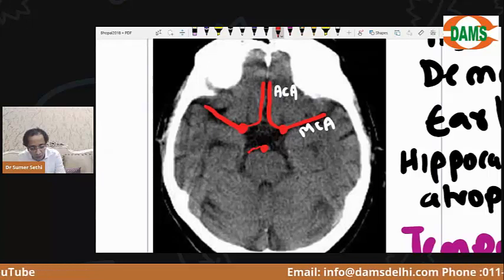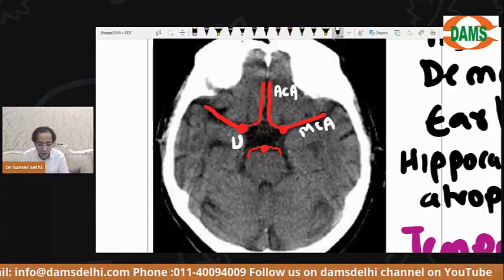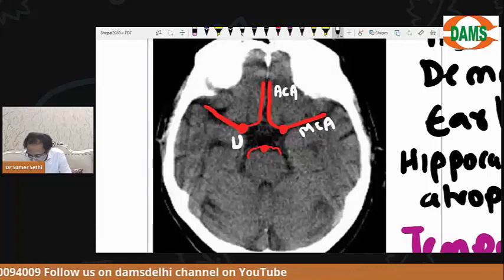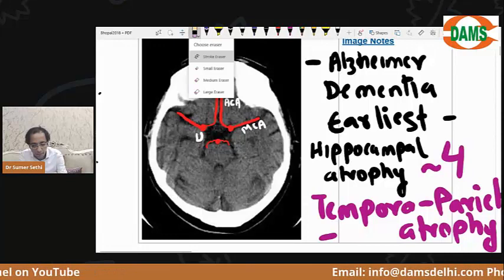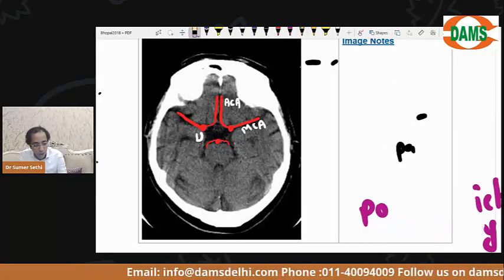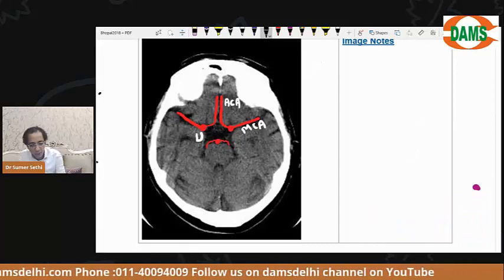This is where you have the pontine branches supplying the pons. This structure is the uncus. The medial most part of the temporal lobe is the uncus. Okay. Now my question to you is this. Everybody now, anybody who is at the Ames level and who has studied surgery, head injury, will try to tell. Let's see if you can answer.